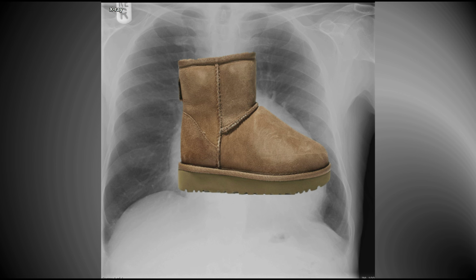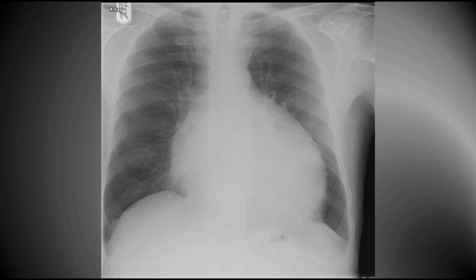Cardiomegaly is associated with a cardiothoracic ratio, that's the width of the heart versus the width of the chest, of more than 50% in a PA film. In cardiomegaly, you often see signs of heart failure, such as pulmonary edema, and the heart border is well defined. In this case, the heart border is globular, with smooth contours, and there is no evidence of pulmonary congestion. So I think that this is a pericardial effusion.